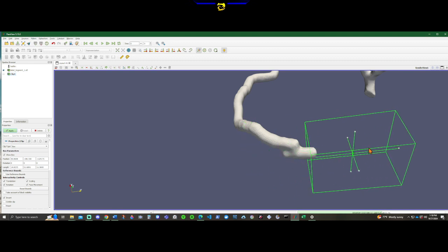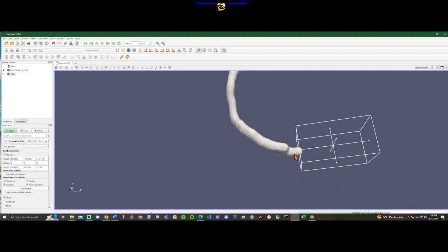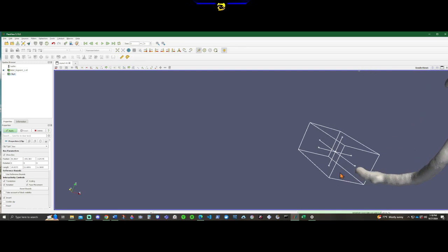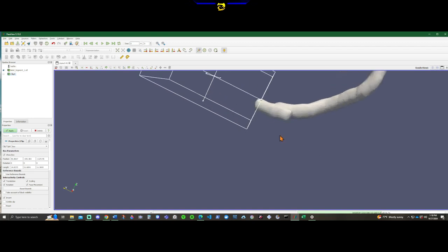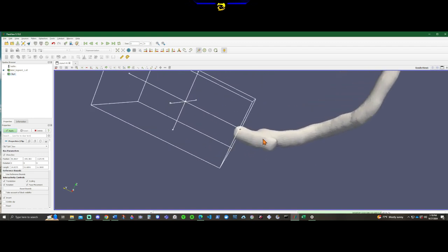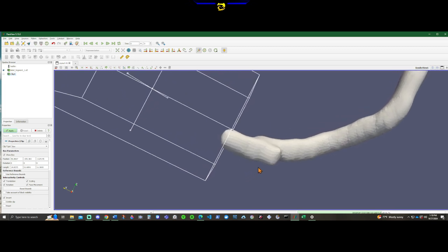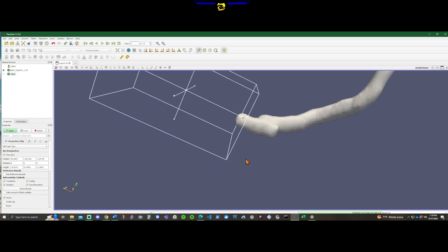This is where some of your 3D skills will come into play. You want to drag that and sort of click it, but not drag anything, just to make sure that it's lining up. The biggest thing with clipping is ensuring that this top line and the bottom line line up or are parallel to the surface that you're clipping.